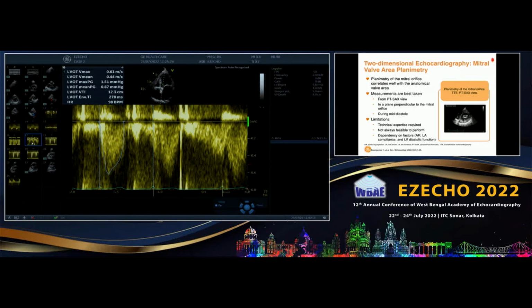Anything above 2.5 is abnormal. Why am I saying above 2 is abnormal? Can you give a mathematical explanation? Because here you had that luxury of measuring the annulus. Now suppose there was a prosthetic valve there. You can't see the orifice on 2D. But then this is handy.